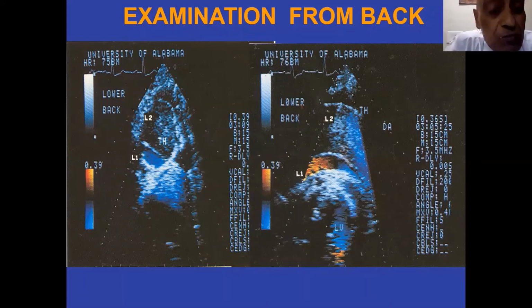Of course, if you get a fish mouth appearance of the mitral valve, that will identify the left ventricle. Always remember that the atrioventricular valve identifies the chamber. If you have the mitral valve, then that chamber is the left ventricle. You cannot have a mitral valve on the right ventricle. Similarly, if you have identified the valve as the tricuspid valve by the position of the septal leaflet, then that has to be the right ventricle. Is that okay?